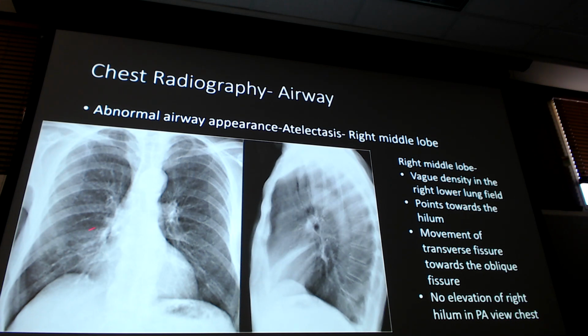Kind of hard to tell. Maybe that's the hilum, maybe, but it's kind of small and hard to tell. So because this one's so difficult, I wouldn't have you guys pull it out with just the hilum. You can use it if you want, but in reality with the silhouette sign and the lateral of this, that's where I know it's an atelectasis.